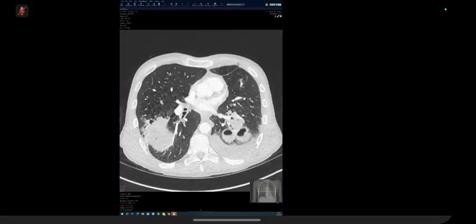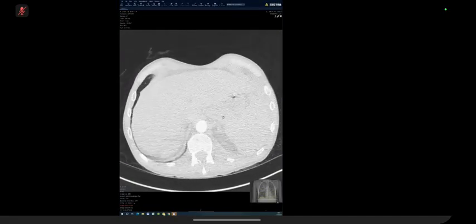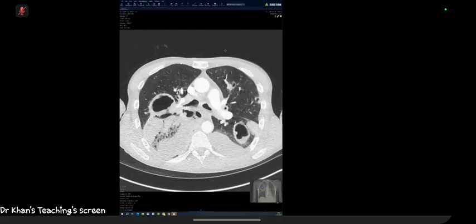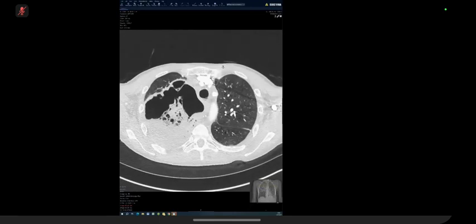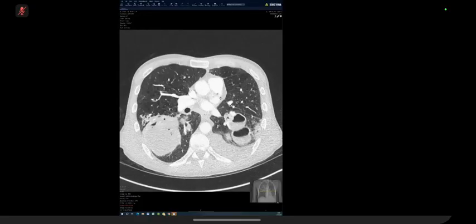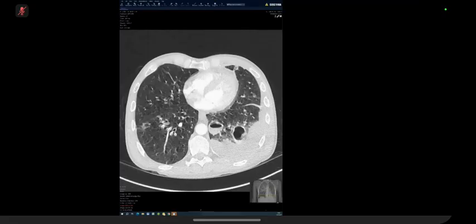This is a large lesion, with a fluid component and cavitation within, with a corresponding cavitary lesion in the region of the left lung. The large lesion that one was discovered in the right hemithorax on the X-ray. These are cavitary lesions, multiple cavitary lesions.